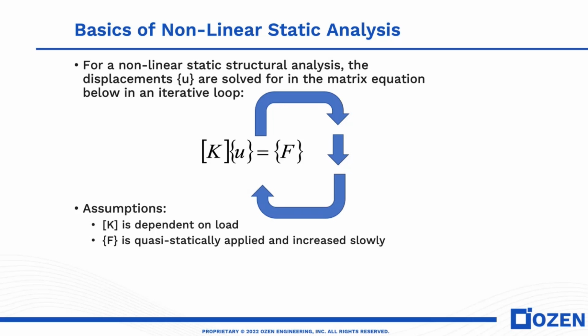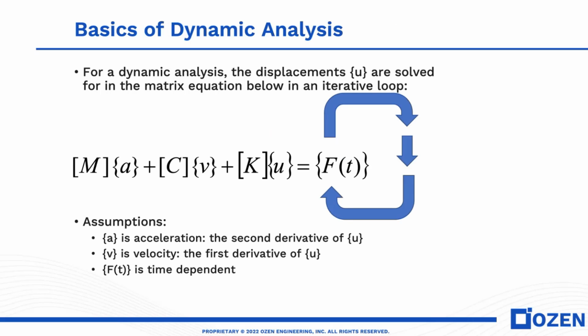And as you know, in a finite element analysis, we are solving this matrix: stiffness matrix multiplied by displacement is equal to the forces. If we are doing a linear elastic analysis, we solve this equation once, and we get the displacements. From the displacements, we calculate the stresses. But if we are doing a nonlinear analysis, which in some of these cases we do, then we solve this equation over and over until we get convergence.